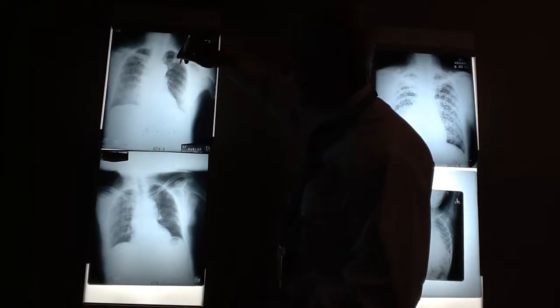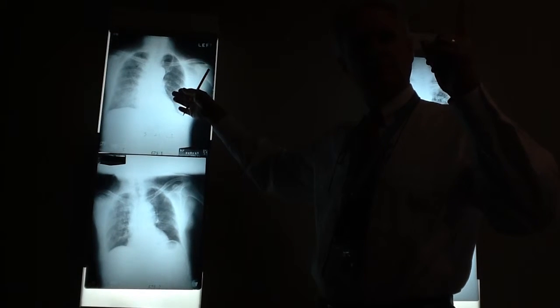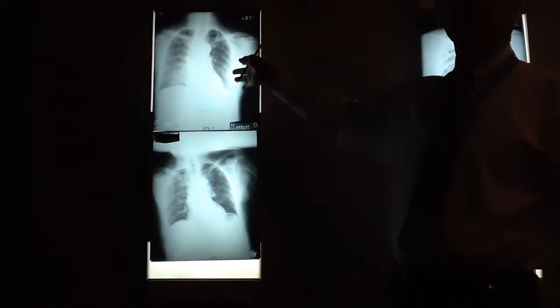These are like little white pencil dots. They're not multiple centimeters. They're not 5 to 8. They're not 3 to 5. There's only one size left: 1 to 2. These are the little tiny miliary, 1 to 2. This is the pattern we typically call miliary.